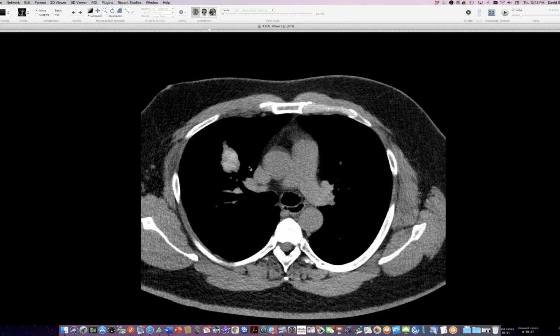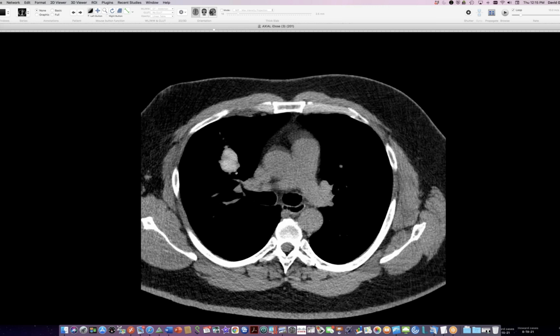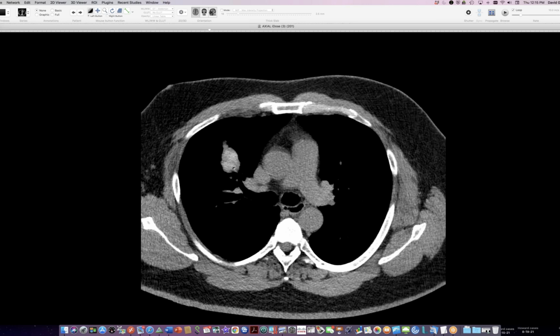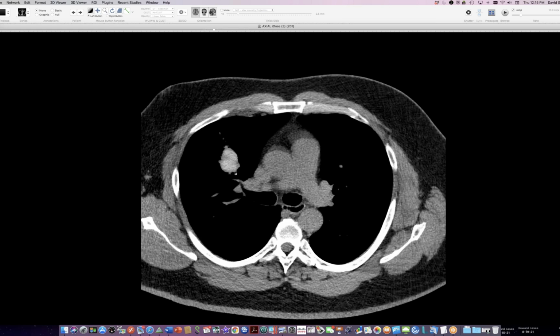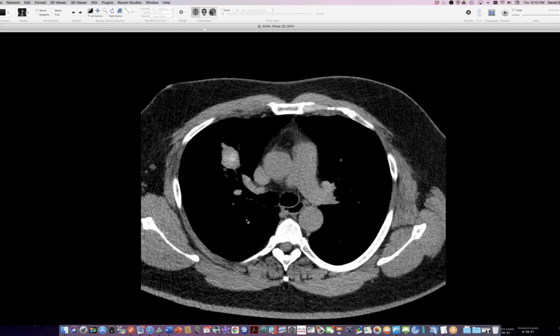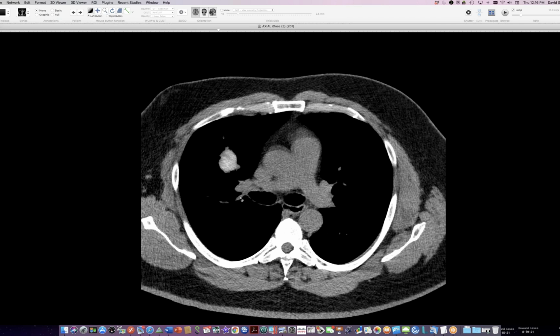So aspergillus is iron avid, so this could be partly iron. Sudhakar said that it was supposed to be manganese. It's probably iron, maybe it's manganese, and there's probably calcium in there too. But we know that aspergillus does try to gather up iron. I think that's one of the reasons why some of the acute phase reactants like transferrin are elevated to fight infection, probably because they want to sequester the iron and keep it away from organisms. Not just aspergillus, but some bacteria are also iron avid. So I suspect that this is probably iron that gives it the high attenuation. But this is allergic bronchopulmonary aspergillosis.